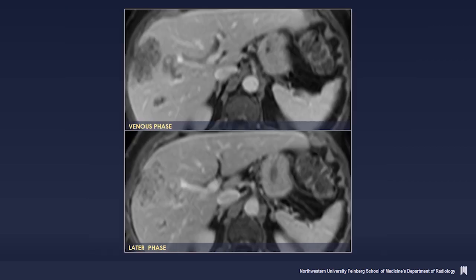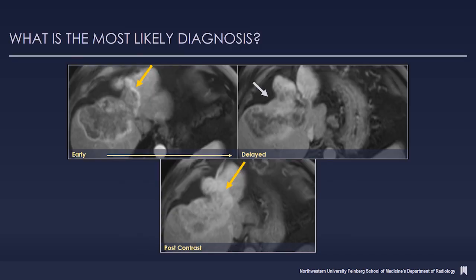And what happened on the 3-month follow-up is illustrated here. Unfortunately, this was cholangiocarcinoma, so the lesion got larger. Again, easier in retrospect. How about this? This is the more typical appearance of cholangiocarcinoma. What do we see here?